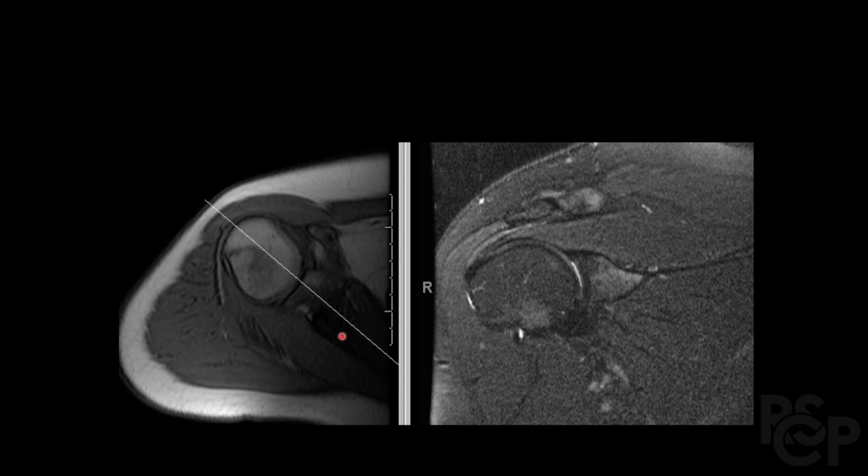The slices are being cut in this direction, and it's perpendicular to the oblique sagittal view, which we'll eventually talk about. So again, this is the right shoulder, and the images are being cut in this manner and then projected over here. Okay, and we're going to work our way from more posterior to anterior structures. So in the posterior aspect, we have the infraspinatus, which is predominantly noted.